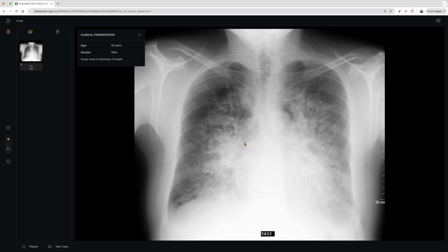Mouthful. But all that being said, in cardiogenic pulmonary edema, the congestion starts mostly at the pulmonary arteries and veins, depending on the pathology, so the pulmonary veins. And what happens is all that pressure and all the congestion starts to seep out here first. So this is actually an early sign of congestive heart failure, acute congestive heart failure. And then it has its distribution first.